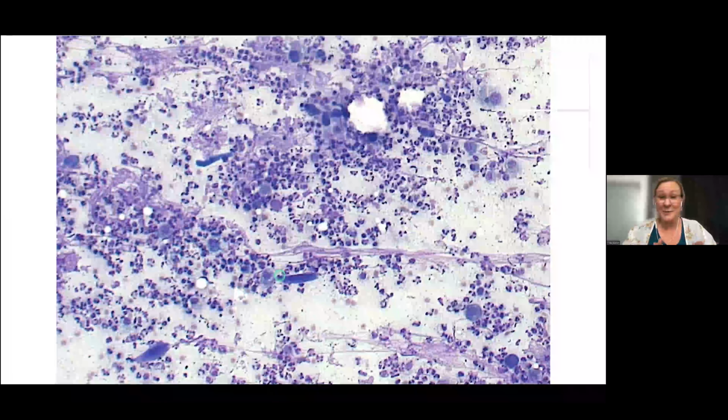Okay, so these are some cytology photos from a representative lung aspirate. Here at this lower objective view, it's a little tough to see all the cells when we're this far back, so we're going to get closer. But the first thing I want you to notice is that it's super cellular. Lung aspirates are typically not very cellular because the lungs are filled with air. So already we are noticing that there's abnormalities here and that there are so many cells all over the place. Once we get closer, you'll be able to see this a bit better, but there are a lot of inflammatory cells in here.